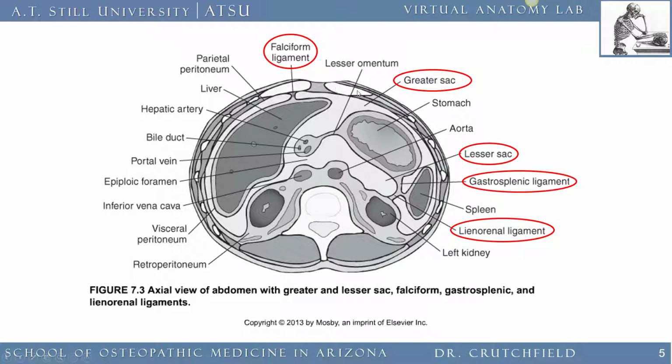Of course, here are the rectus muscles, which we've learned. We have the ribs out here, which are easy to identify. But we're interested in what's going on inside the abdomen. So of course, here is the spinal canal. Here is one of the vertebrae. And then here is the lining of what is considered the retroperitoneum down through here. So this is all retroperitoneum that's back here.